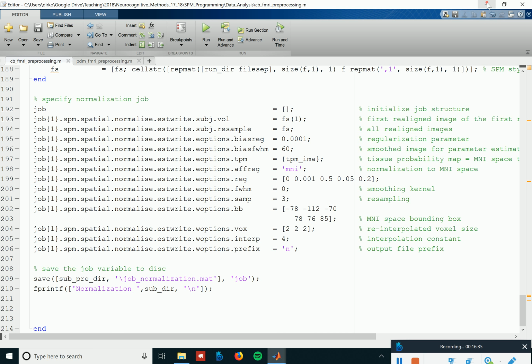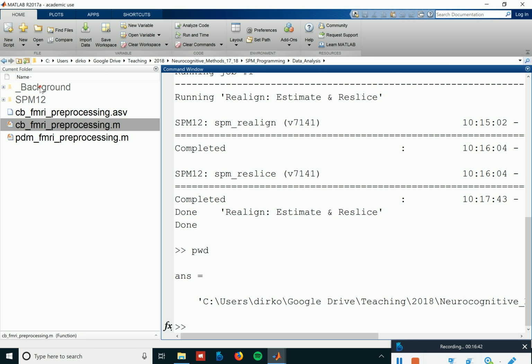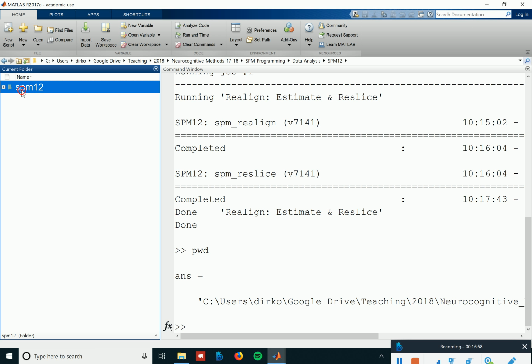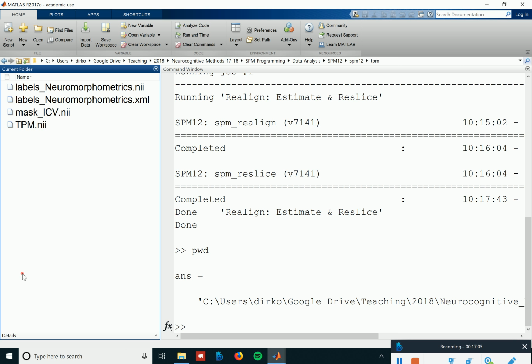So our SPM distribution is in our working directory, so we should be fine with the print working directory, and then specifying the correct SPM folder. So that would be print working directory, and then it's in the tissue probability maps folder, which is here, and we have this.